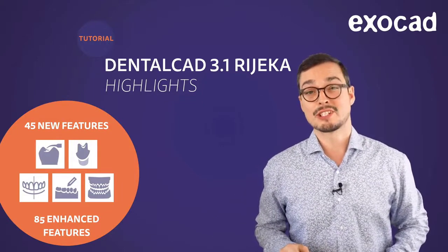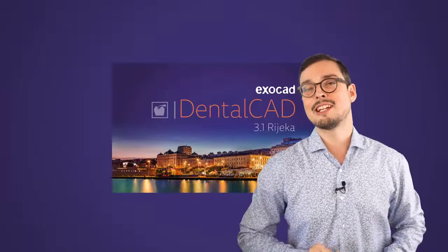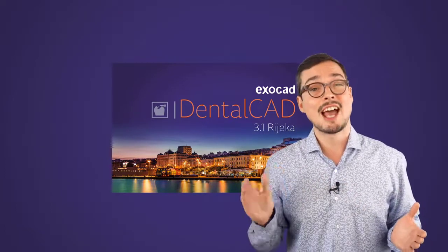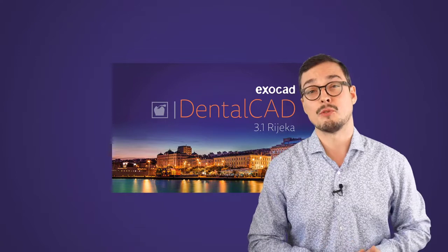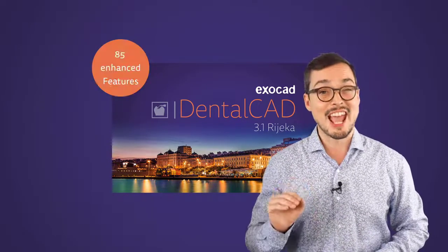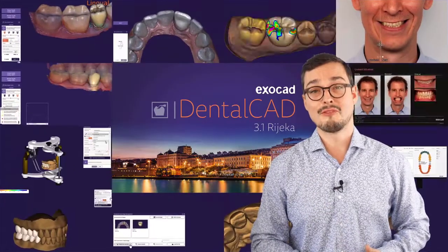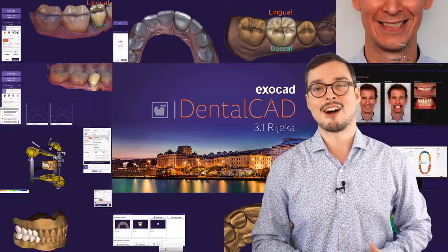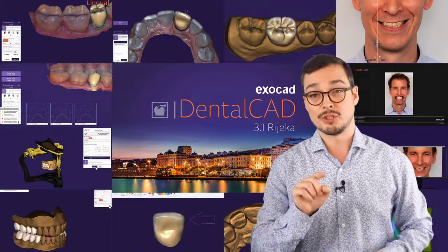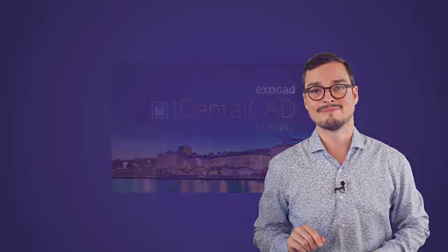Today we are proud to present to you the highlights of DentalCAD 3.1 Rijeka. This release is the result of countless conversations with our customers, friends and a dedicated research team of software developers. We implemented 45 new features and enhanced 85 features as well. So you will find your favorite tools more efficient and convenient in a simplified design journey to save many clicks and plenty of time doing your design. Let's explore the new features together in the next minutes.